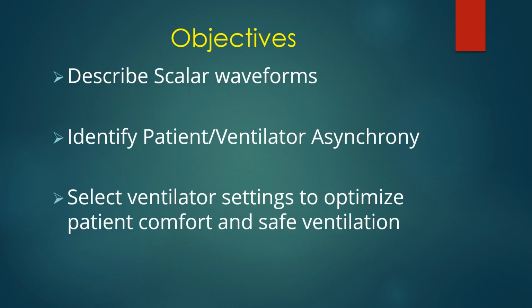When our ventilator is ventilating the patient, the ventilator gives us a lot of information numerically, but also it gives us information graphically. Using the graphics, you can optimize the ventilator settings for the patient, make the patient more comfortable, and make the patient synchronous with the ventilator. If the ventilator is not in sync with the patient, or the patient is not in sync with the ventilator, the numbers don't tell us that. The numbers tell us a lot of valuable information, but we can see the same information looking at the graphics, plus much more.